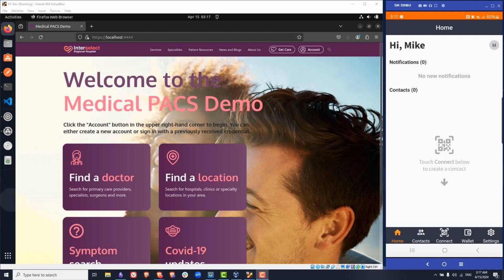And then some pieces that are behind the scenes that you won't see, but that have a big influence here are, of course, Amazon Verified Permissions, and then Aries Cloud Agent Python, or ACA-Py, and Proven, an ACA-Py controller. So what we'll do first here is we'll walk through getting an account, and then we'll get a credential. We'll query Amazon Verified Permissions, and then we'll access the data.